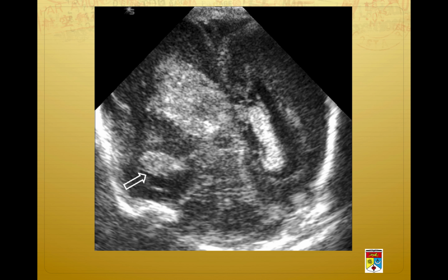So this is an ultrasound. Again, I talked to you earlier about ultrasound. If it's very black, then it's fluid. If very bright, it could be blood or it could be calcification. But if it's in between, like shades of grey, it represents the brain parenchyma. So like in this case, it's brain parenchyma.